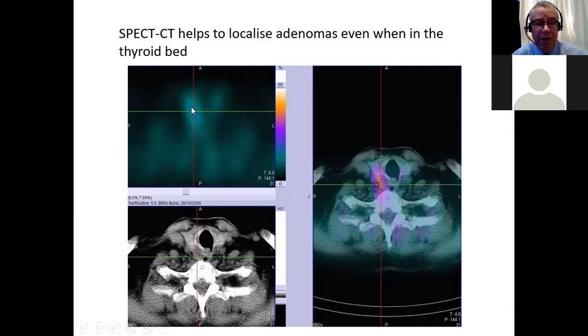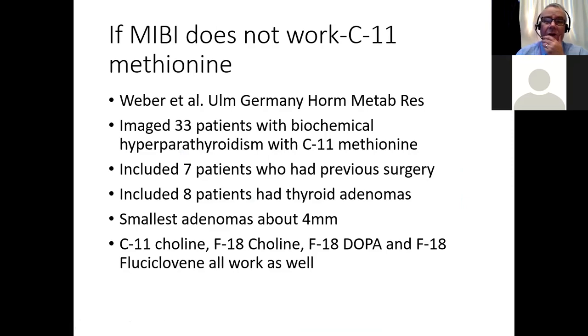behind the thyroid. Now, also, that's the top of the thyroid, that's the bottom of the thyroid. So it's not quite at the very bottom, but it is a lower parathyroid. So it will be a right-sided lower parathyroid. And that's all you need to tell the surgeon. They'll find it after that because they'll know where to operate and find that tumour.